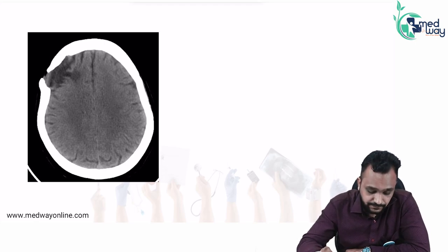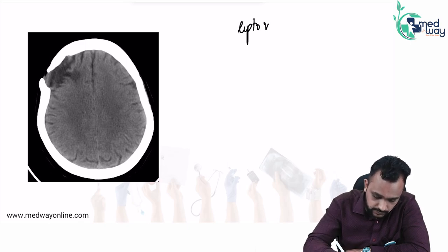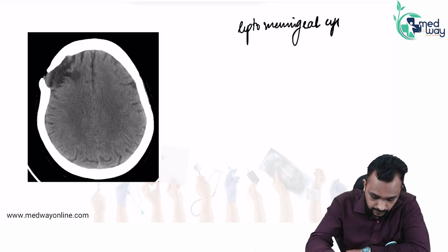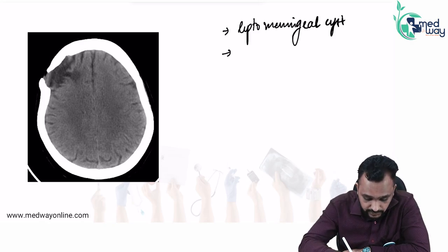Now coming to the next question or next image. So what are you able to identify? This is a spotter. So this is a case of leptomeningeal cyst, or growing skull fracture. So what happens?